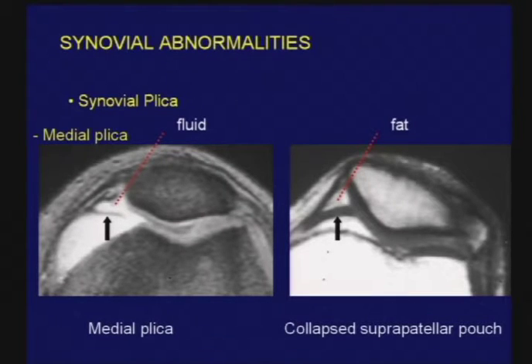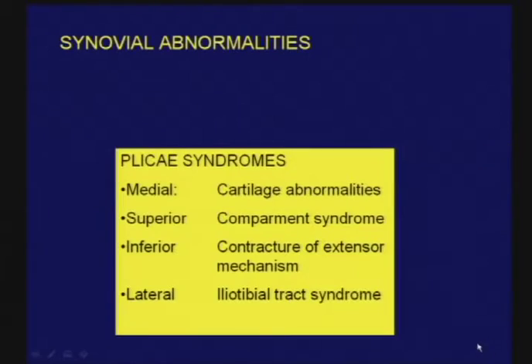And if you think back on the way that you diagnose knee effusions on lateral radiographs, you use the location of two fat pads and you measure the density in between. You're measuring this density between these two fat pads. So this is the suprapatellar pouch.